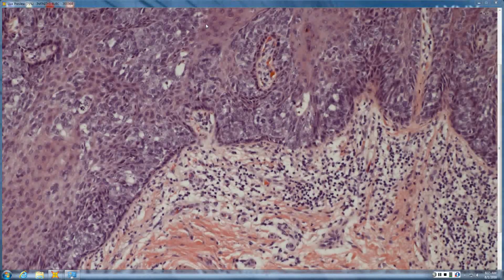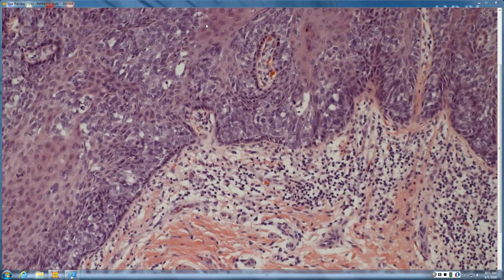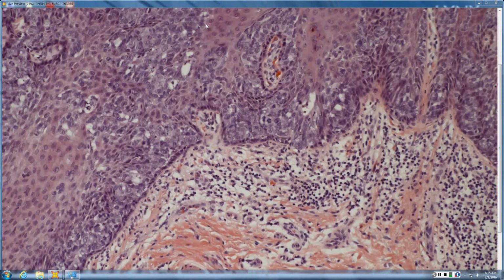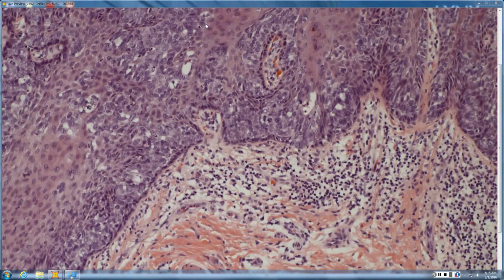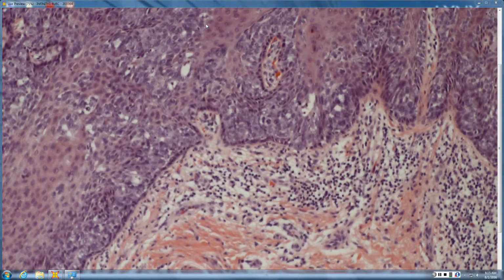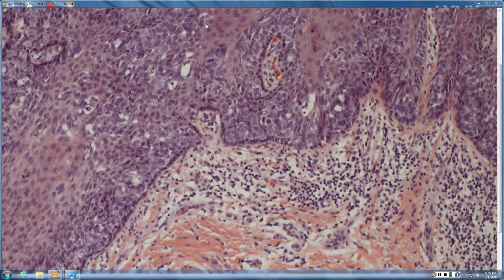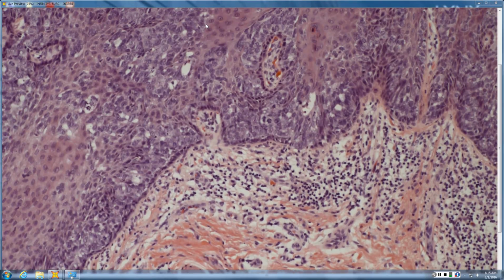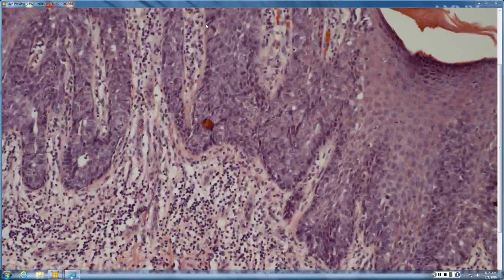Very ugly. Go ahead. So, looks like you got some atypia throughout it, but they're blue but very pale cells. It looks like it's preserving the DEJ for the most part, kind of smashing up on it. Yeah, so you have a crushed basal layer, eyeliner sign. And then you've got a little interface dermatitis as well along it. Seems to go full thickness there in the center, but then it looks like it's sparing some other areas.